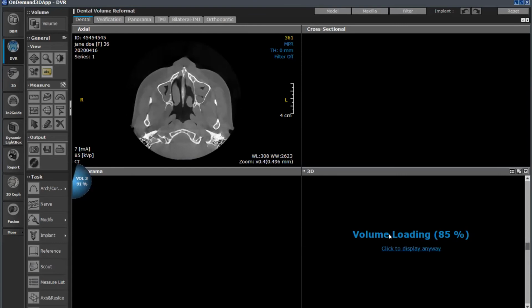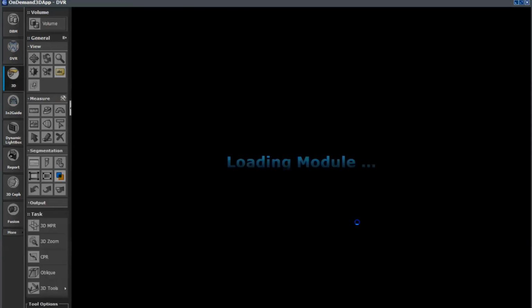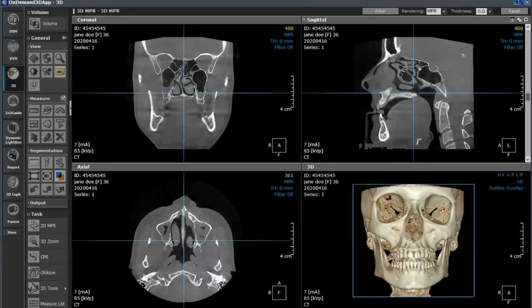That'll be one of our courses coming up in which we're able to do this, to where as you get an image like that in this size, you can see that this image now gives you the full face, and you're able to see the full airway as well, so you can make that evaluation. Now, the beauty of having either one of those fields of view is that you can get the full dentition or the full face, full sinuses, what have you.